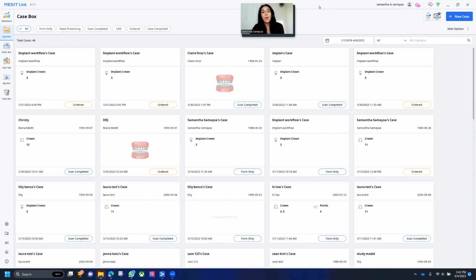Many of you guys today are new to digital dentistry and or implant workflows. So we're going to cover a few things. I am going to be improvising as well for a few things just because I don't have a real patient. That's okay. You guys will understand it.